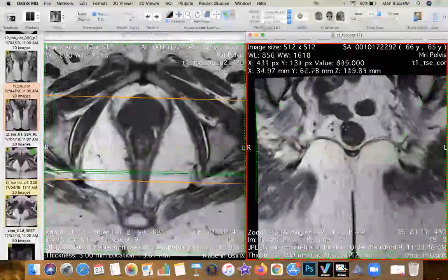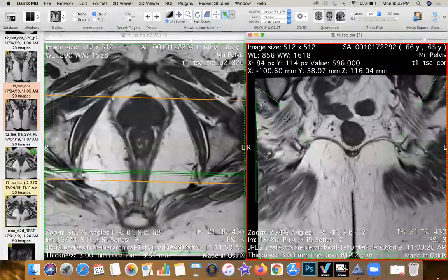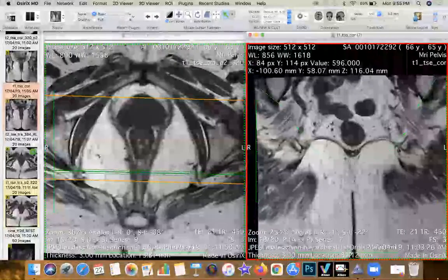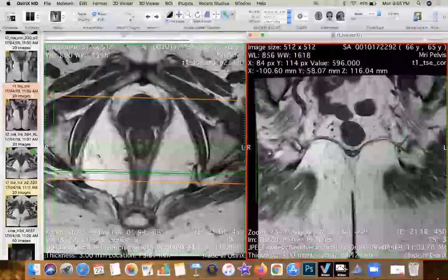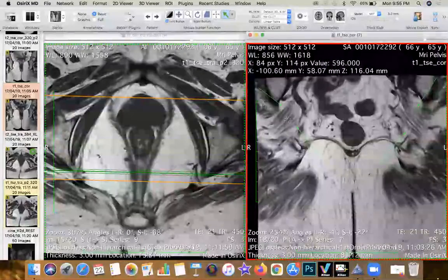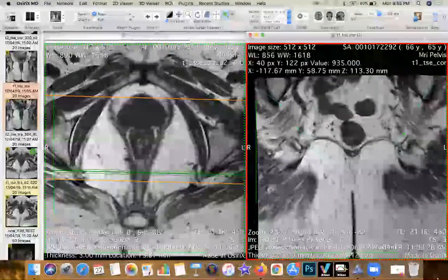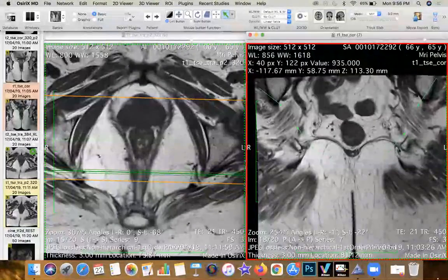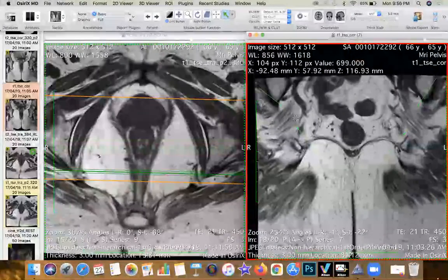So the first thing you look for is symmetry. Look for preservation of the intrafascicular or interfascicular fat. Look for the equidistance. If the nerves are aggregated or clumped together, you need to start worrying whether there's some form of plexopathy in these locations. Also, please remember that these nerve roots extend primarily through the greater sciatic notch, and that also is divided into two components by the piriformis muscle.